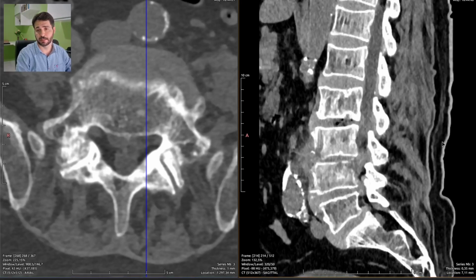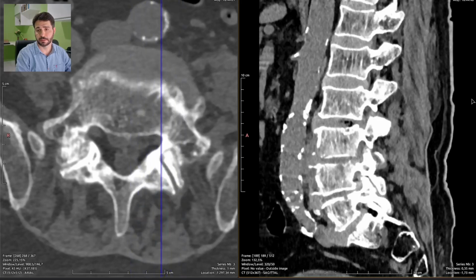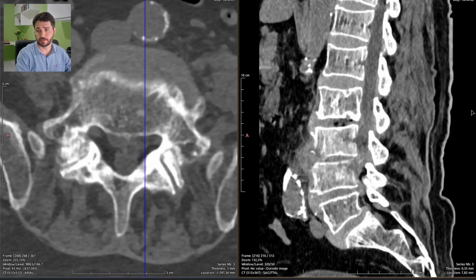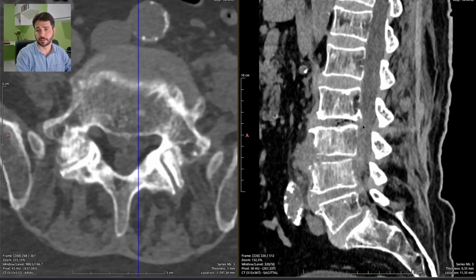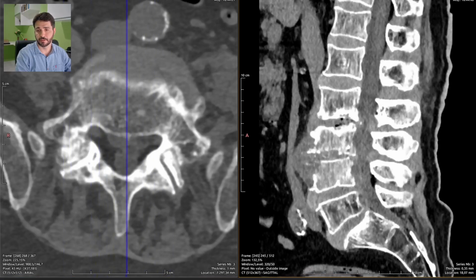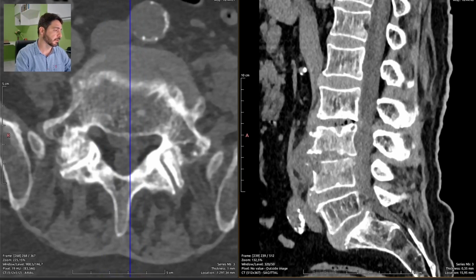And right here you guys can see there are signs of gas inside this intervertebral disc, which points to severe end-stage degenerative disease of the discs. And there is also partial ossification of the discs, which is also a sign of end-stage degenerative disease of the discs. So this is quite severe and really common for elderly patients. So we get used to reporting these kinds of signs eventually.